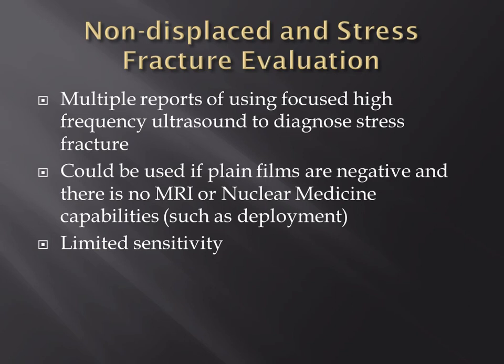So we've also mentioned ultrasound a little bit for fractures. Now, there is a small body of literature that talks about using ultrasound to evaluate for stress fractures in the foot, again using a high-frequency transducer. I think this has some benefit for those of us sitting in this room, because we may not always be in a position where MRI is available. Obviously, MRI is going to have higher sensitivity and specificity, but in a deployed scenario where you may only have plain films and ultrasound, this could certainly come in handy. If you have a negative plain film, an ultrasound interrogation of the metatarsal may show changes before plain film radiography would for a stress fracture. But again, if I'm at David Grant, I would still prefer an MRI as opposed to an ultrasound.